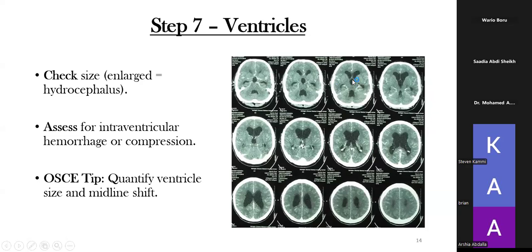You can see normally the third ventricle is a slit-like appearance, but here it is sort of rounded. Then finally, we have the fourth ventricle. The fourth ventricle is almost described as a Maasai arrowhead. It is thin, narrow, and it forms like a slit or a crescent shaped. But here you can see that it is also quite dilated. So this patient has got dilatation at all the levels.